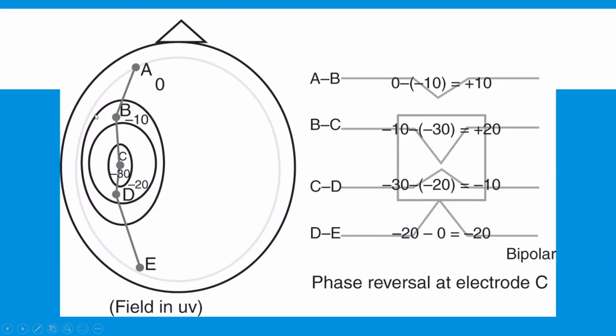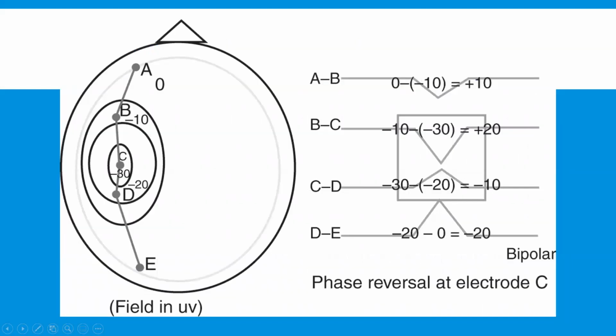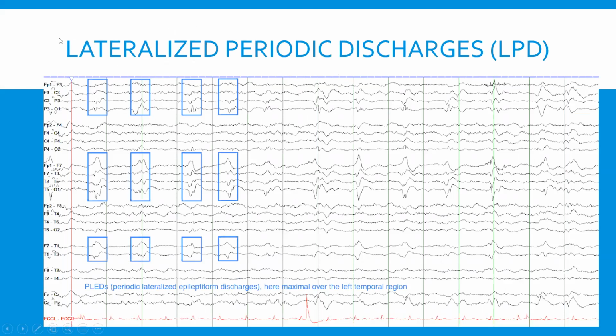I don't think you need to understand the math precisely, but just understand that when you have a seizure discharge in C, it's basically like dropping a pebble into a pond. The discharge spreads out from close to far, and it looks different depending on if you're far or close. Having this knowledge allows us to locate, especially in this EEG, exactly where the seizure discharge is coming from. We can say it's coming from exactly F7.